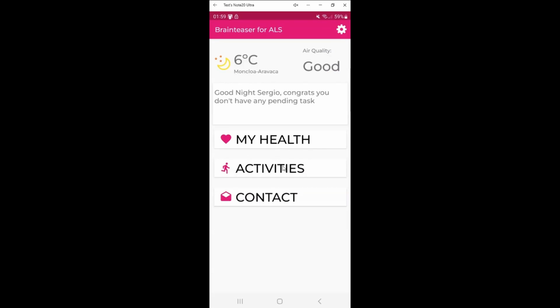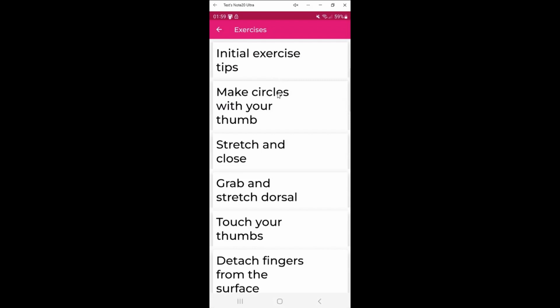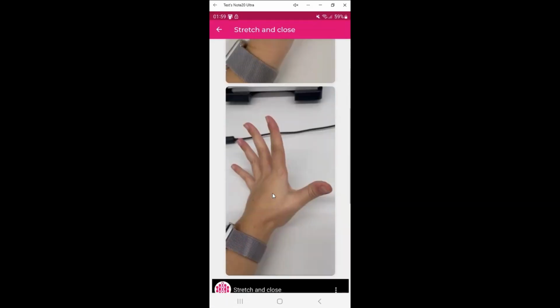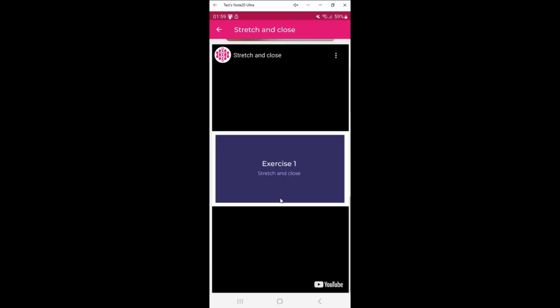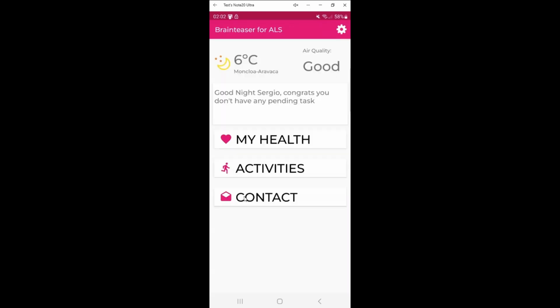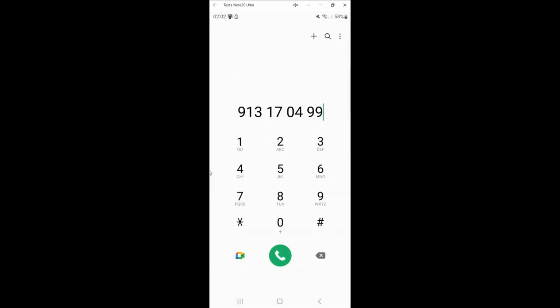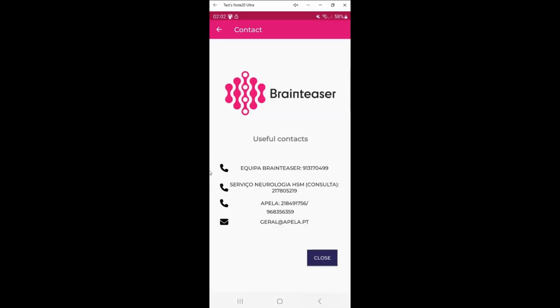During this period, the educational content has also been expanded, adding 3 categories, 1 for general advice and 2 for exercises. In addition to expanding the content, support videos have been incorporated into some exercises to make it easier for the patient to understand how to perform them correctly. Different contacts have also been added in the corresponding section, which vary depending on the patient's center and disease, and always include how to contact the follow-up unit, as well as other relevant contacts.